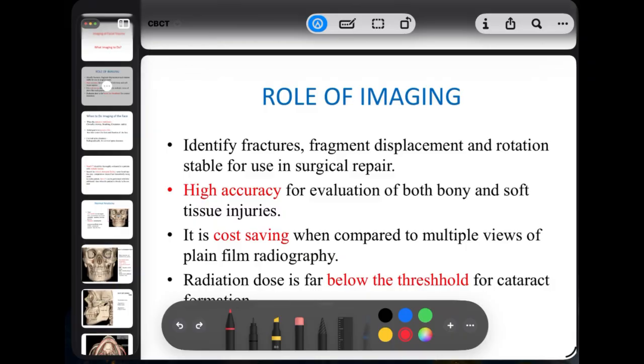Hello, everybody. Most people look at a CT face scan and they see just black and white images. But what is a CT face? It's basically a 3D X-ray of the facial bones and soft tissues used to detect fractures, infections, tumors, and even hidden pathologies that you cannot see clinically. And while it looks complicated, it becomes very simple if you follow the right system.